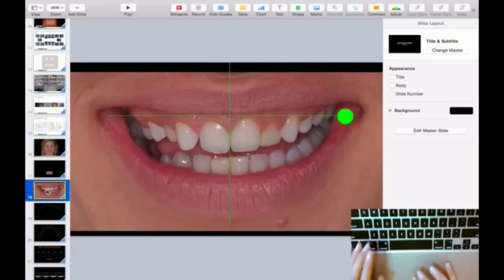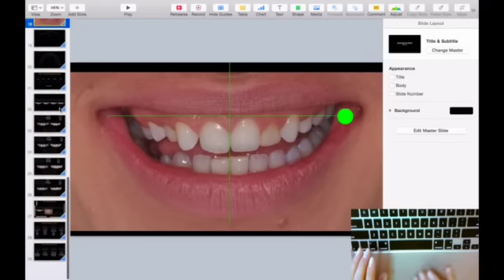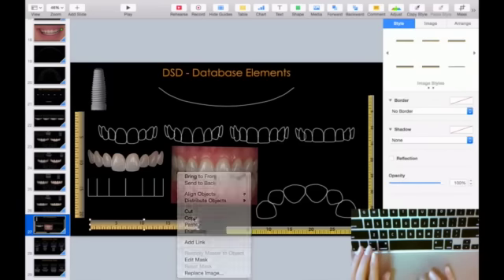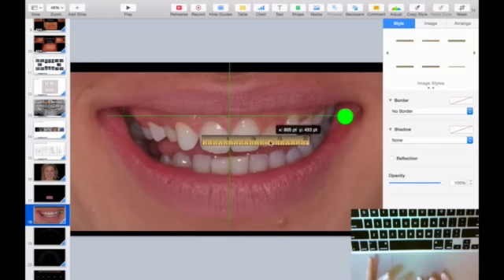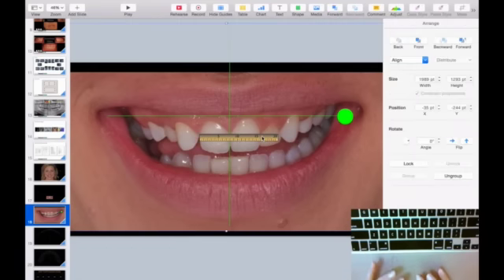And now I'm gonna calibrate this. So I'm gonna go to my template down here, my slide, and I'm gonna get my ruler. I'll copy it and I'll bring it here. And for that, we learned in the course that we measure this distance. Let's say this patient, Rachel, she has a 16 measurement distal to distal of centrals. So I have this calibrated over here.